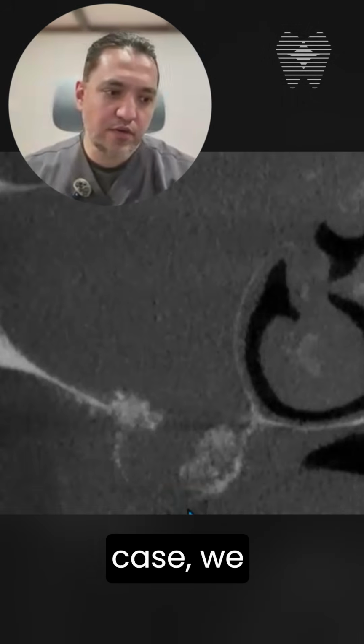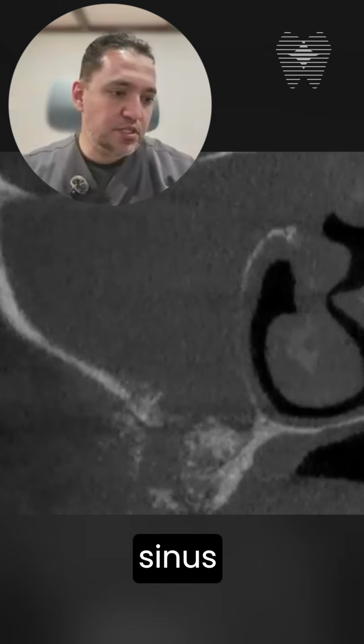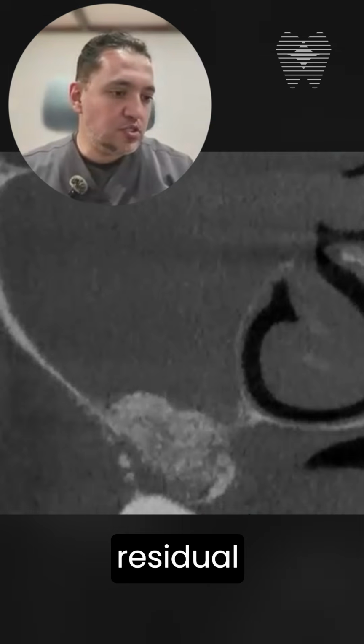In a different case, we also had an attempt of doing a sinus lifting with a completely opacified right maxillary sinus. Most likely, these cases lead to complications, or at least will not lead to a successful sinus lifting. Sinus lifting procedure is mandatory when we have a sinus pneumatization or a limited residual ridge height.